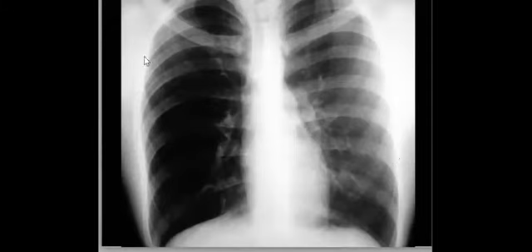Here you can describe it as hyperlucency again. So when you find it, it can be unilateral or bilateral. Your first step is to see whether it is unilateral or bilateral. So it's unilateral like this, which is much easier. It can be technical, like rotational, as you mentioned, Nermeen, perfect. So first rotational, and then Poland, a very nice differential.